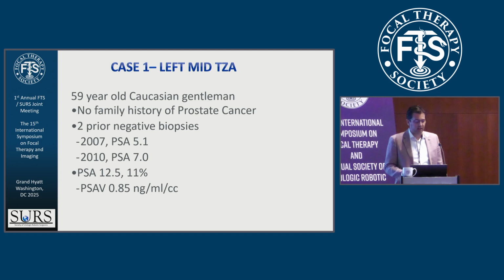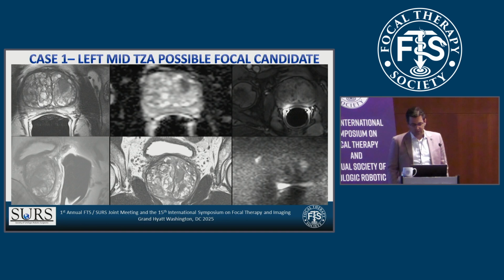This is a 59-year-old gentleman, 2 prior negative biopsies. His PSA has increased up to 7. Looking quickly, does everyone see the lesion? Raise your hand if you see the lesion. Unbelievable progress. I am very happy. So you see this left TZA lesion.